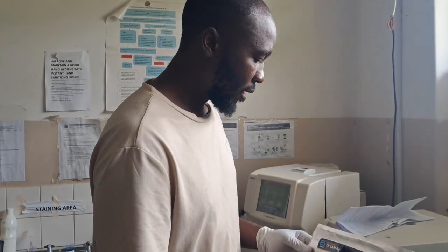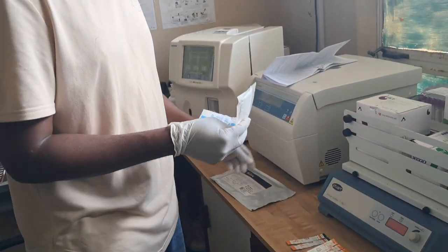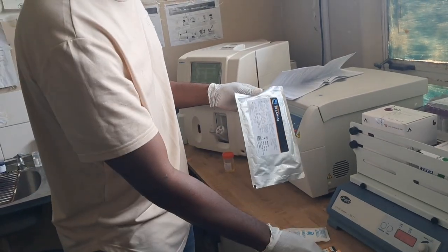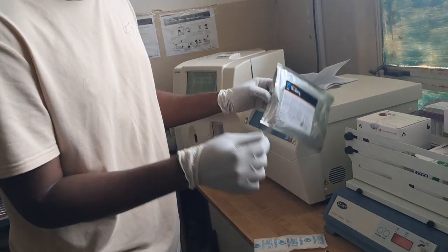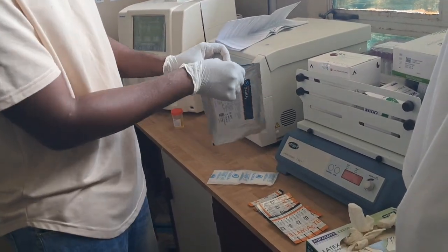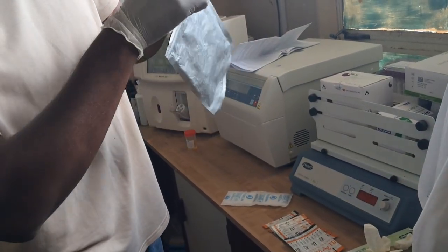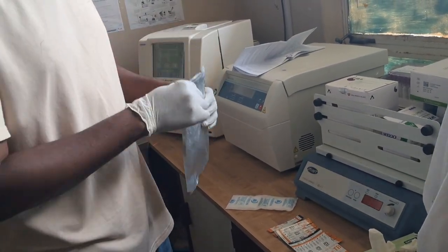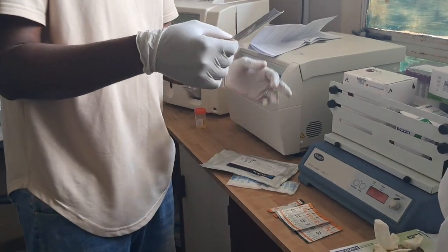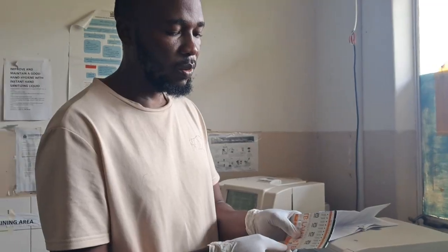That's storage. Then the other thing, these desiccants, every time you have taken a strip from the kit, you put them back. You even put back the desiccant. Then there's a ziplock here. You make sure you tighten. Why do we do this? As we know, we have seen most of our RDTs, these are moisture sensitive. So when they get wet, they may give us a false negative or a false positive. That's storage.